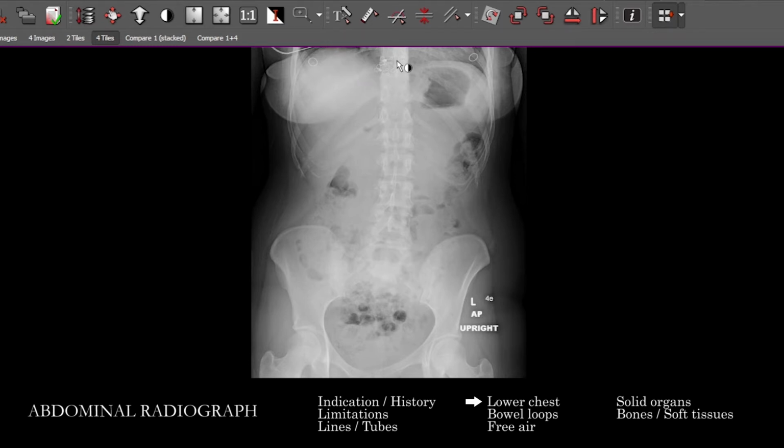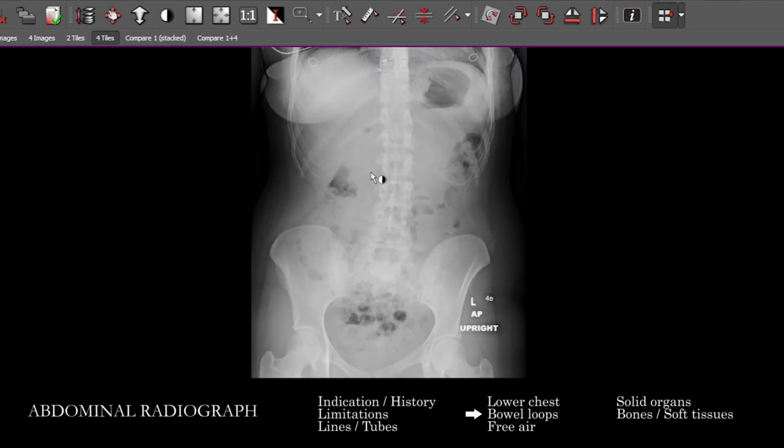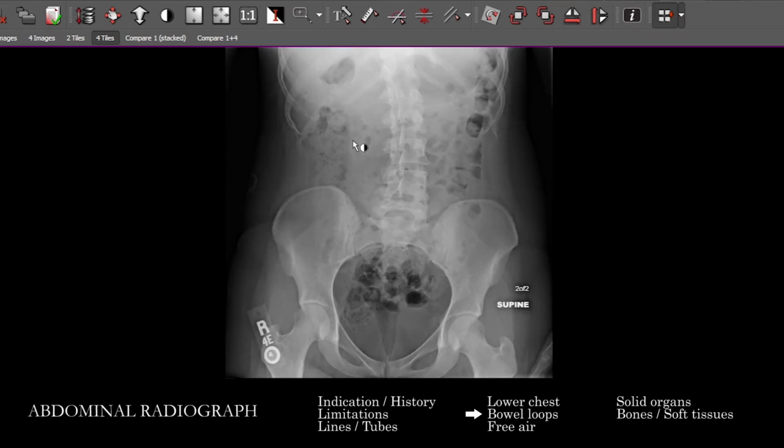We're looking for mass lesions or nodules. It can be easy to miss pulmonary nodules, some sort of incidental pathology that we're imaging at the edge of the study here. So I make sure I look at that so I don't forget. And then the next step typically is I'll look at the bowel loops. Both on the upright and on the supine views, you can look for distended loops, but on the upright view, you're going to look for air fluid levels. You want to look for stacking, for abnormal dilatation, for displacement of bowel loops. And we're going to look on basically every view for that.